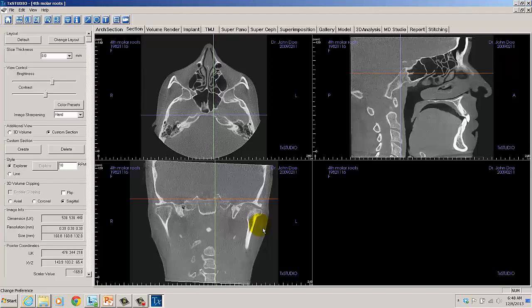We also have a couple of other measurement tools. As I'd said, we have the angle measurement. Left mouse click that to activate, and then you can left mouse click, draw the first ray, left mouse click for the vertex, and then the other leg of the angle or the other ray, draw your line by dragging your mouse and then left mouse clicking, and it gives us an angle measurement.